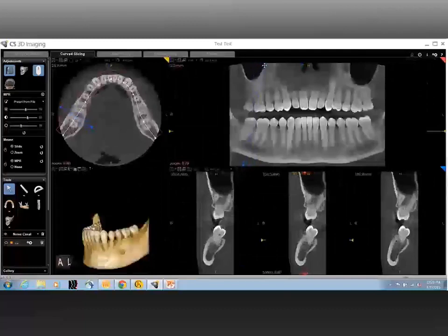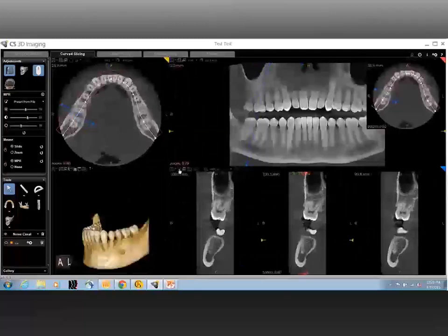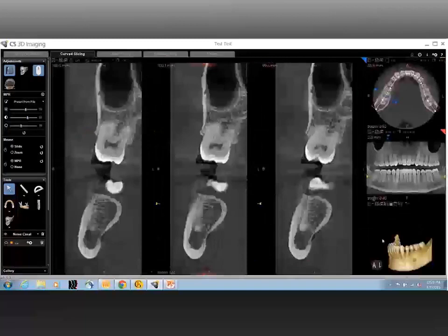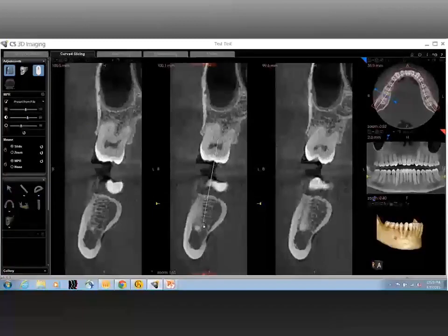And a few things to be noted, and I have to emphasize that it is not limited to what I say over here, but the common things to be noted in terms of implants is, number one, the angulation of the ridge. The angulation of the ridge would give you an idea of how the ridge is in relation to the opposing dentition.